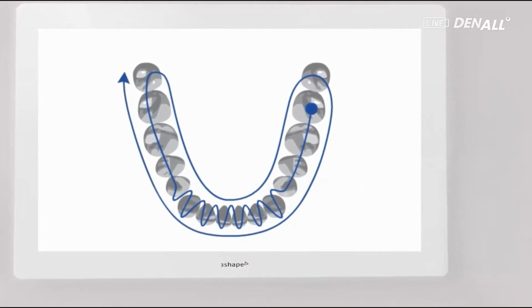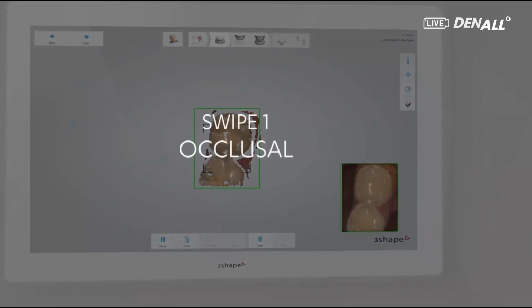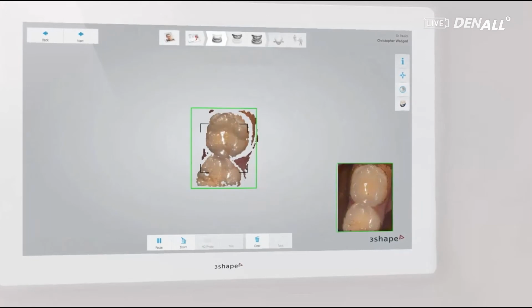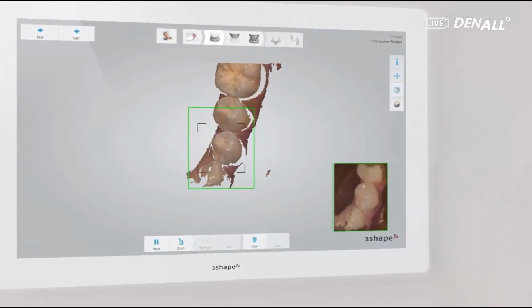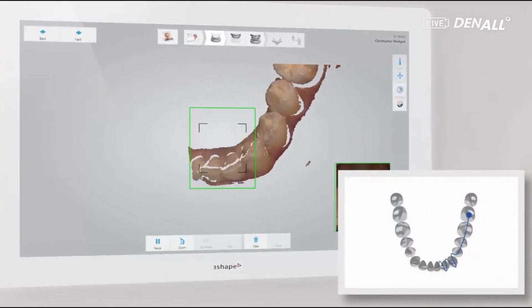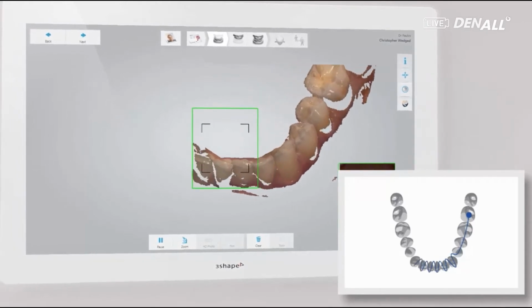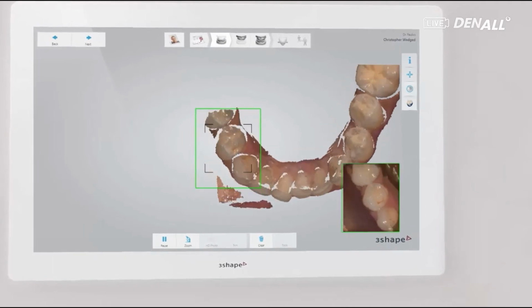So there are a lot of distortions in the data in the case of a full mouth. A one-body prosthesis for the full mouth may have lower precision in terms of fitting. So for full mouth scanning, this strategy should be adhered to.